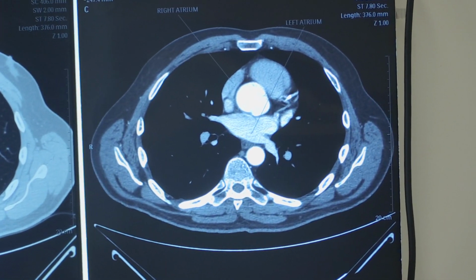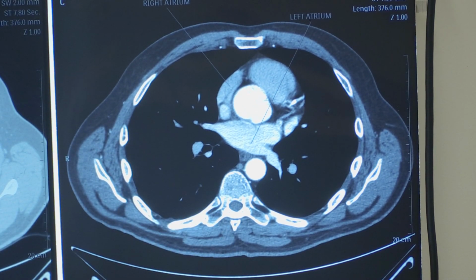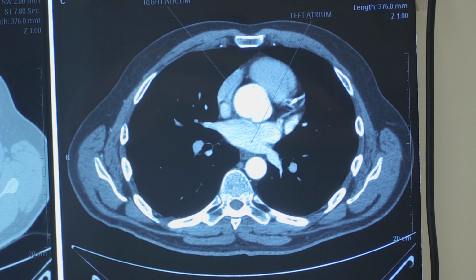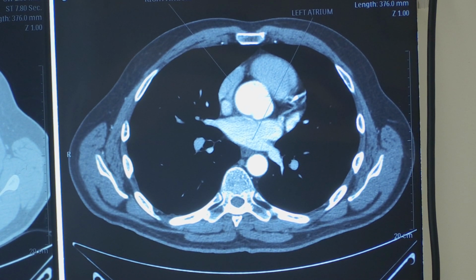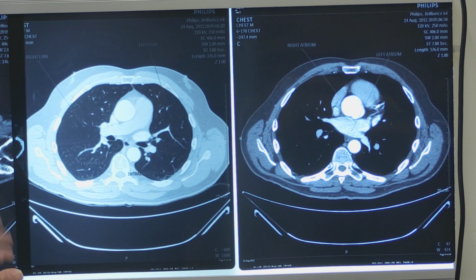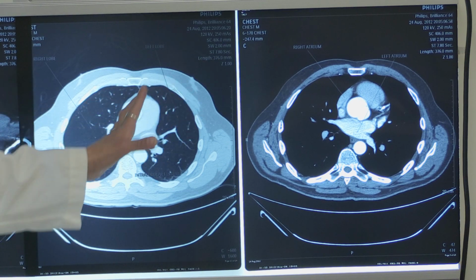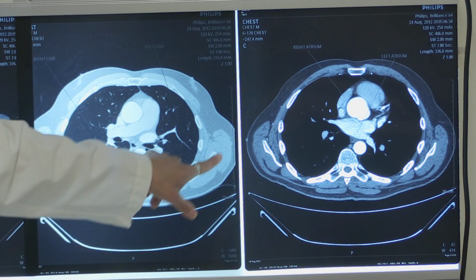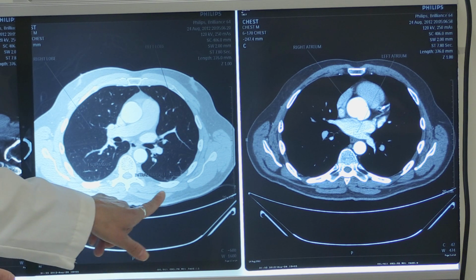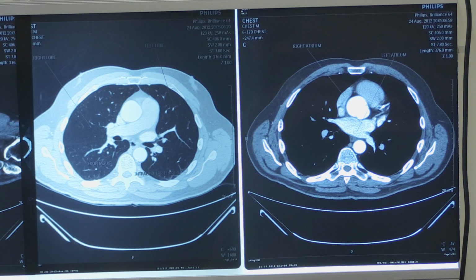You may have noticed that the contrast on this image has changed from the priors and after. That's just to show you that this is a lung window. We're looking at the same patient scan in a different window. So we want to focus our eyes on the lung tissue. It has made everything else look a little brighter, but it's also lost some detail. Like the muscle looks a little wider and the bone is a little washed out. That's because we changed the window.